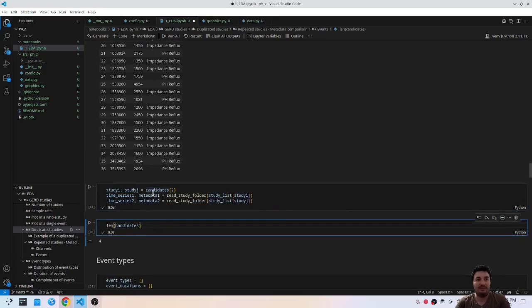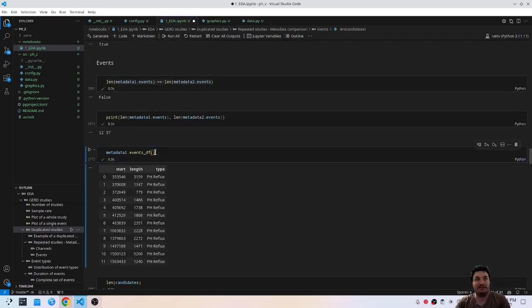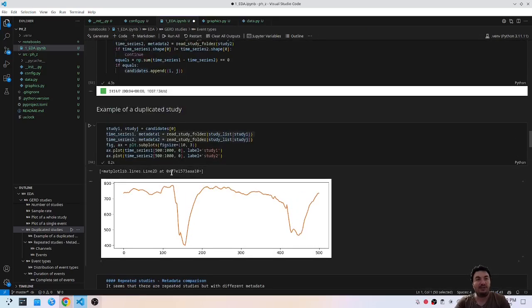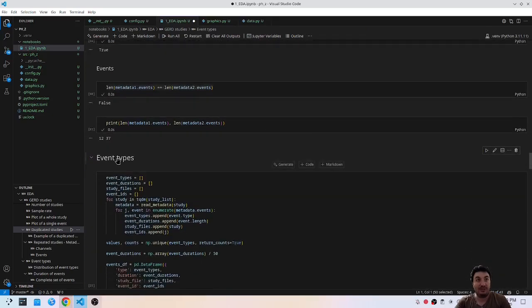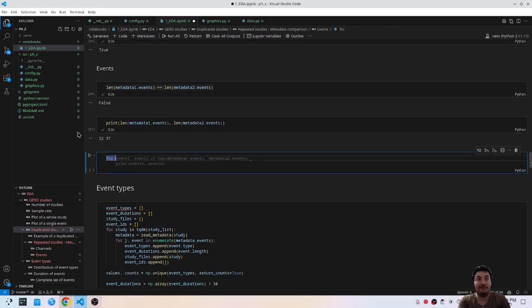If we are missing some data, we can just, I'm not very keen on removing data actually, but okay, let's point out which are the repeated ones. Which are study list 4. Okay, 4 no.